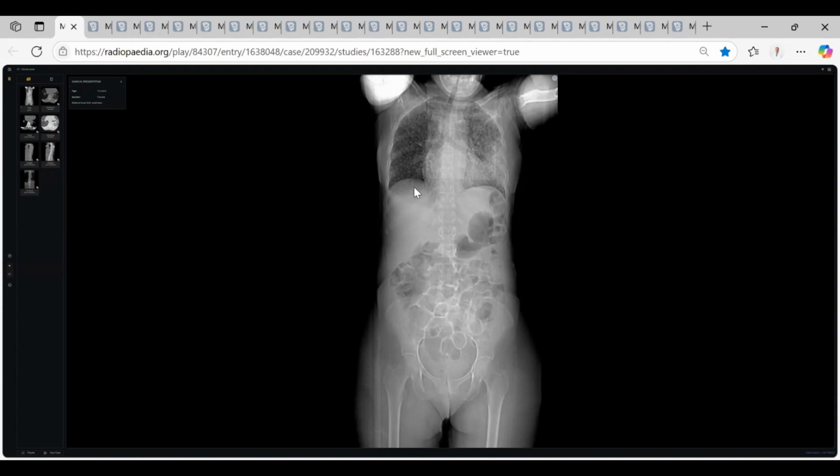My colleagues, when you face a scout or X-ray like this, put TB, miliary TB, on top of your differential diagnosis list. The examiner will not be unhappy at all, even if it is not TB, and you are a safe radiologist. You can also put miliary metastasis, no problem. But at least this is miliary nodules: extensive and innumerable tiny nodules in both lungs.